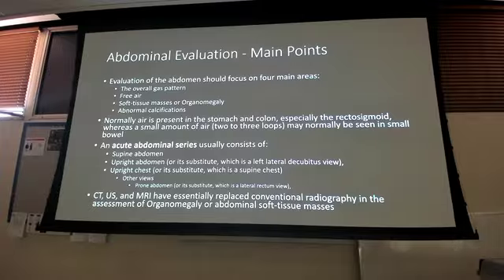So when we get to these x-rays, if we see a spleen that is coming down inferior to the 12th rib, guess what we have? We have splenomegaly. And you can call that because we know that the spleen's not supposed to be past the 12th rib, right? So we can see this stuff on x-ray. That's what we're going to teach you to look at. Abnormal calcifications, look at those as they come through. And this is what it talks about.